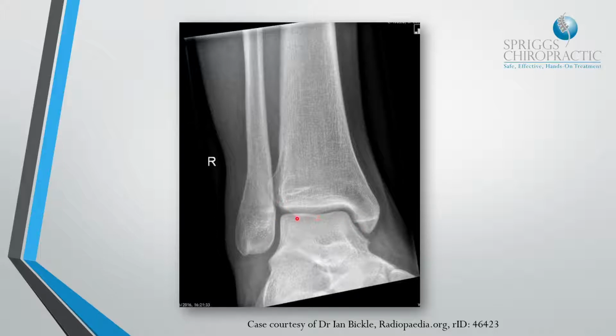Okay, so obviously the evaluation of the dome of the talus. What you're looking at just here, because this always confuses people, is not a completely flat surface. The dome of the talus, because the ankle, this is better seen on the lateral ankle projection I'm going to go through with you in a second, but you're looking at a domed surface. So when you see almost like the horizon of a domed surface, it will look flat, but it obviously isn't. It's curving away from you when you're looking at it. So it's a bit of an optical illusion with this.